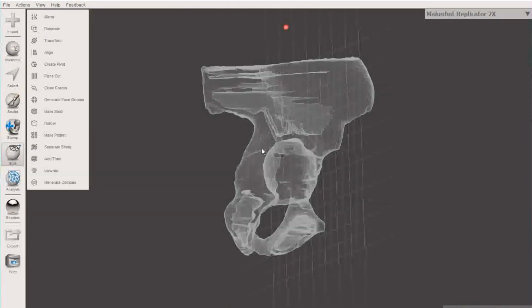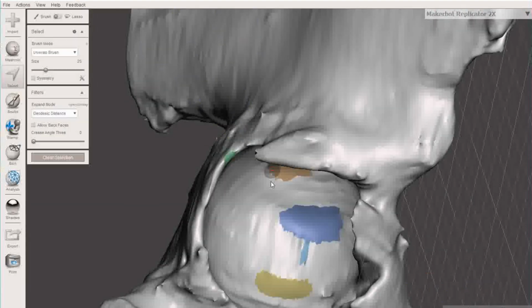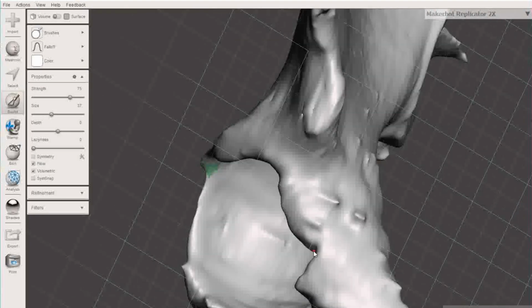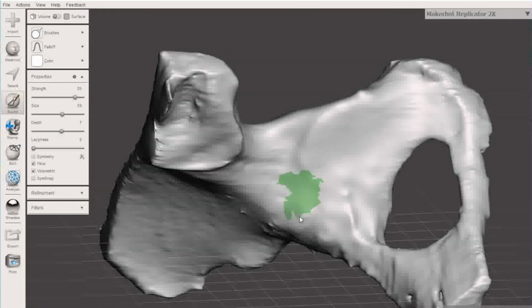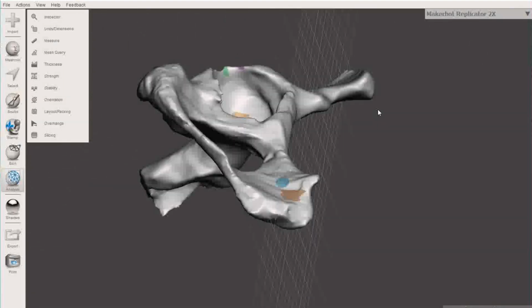During the post-modeling, we try to eliminate all defects and unnecessary internal structures. Missing structures such as gaps or holes are filled to create a closed surface. The surface is being smoothed to recreate a bone-like appearance.